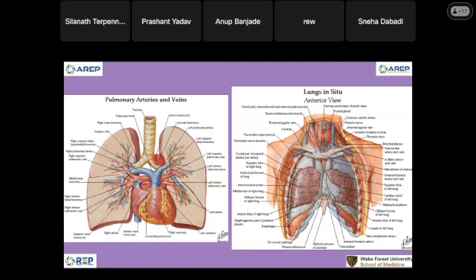So you hear about the word hilum. On chest radiograph, when we talk about the hilum, we are talking about four structures: the airways here, the pulmonary artery here, the pulmonary vein, and also the lymphatic system. They all pile up right here. This is the right hilum, and this is the left hilum. And you see these lines here. So this is the fissure of the lung.